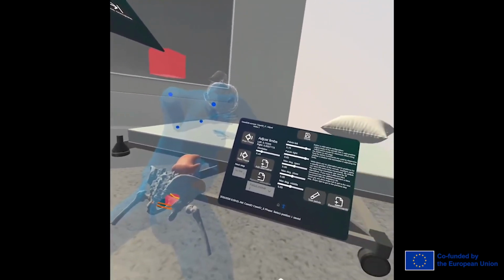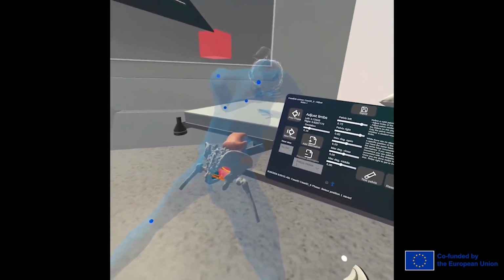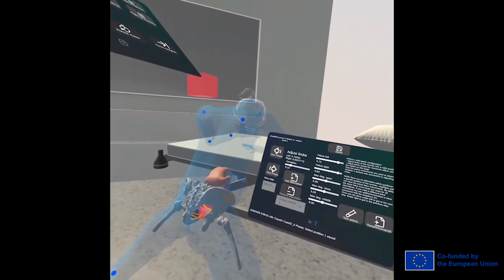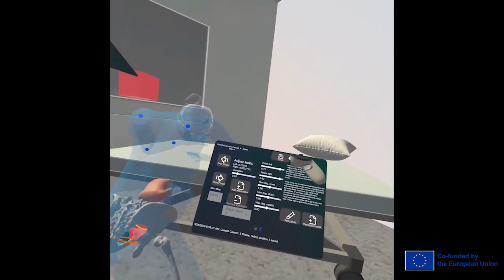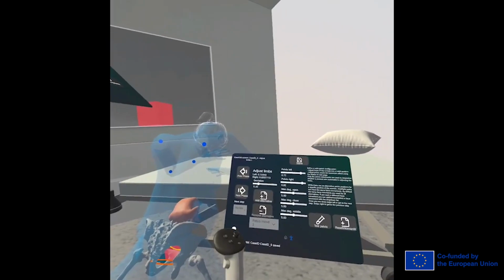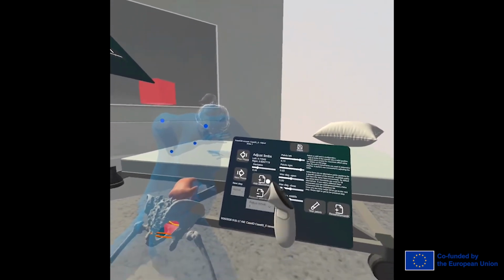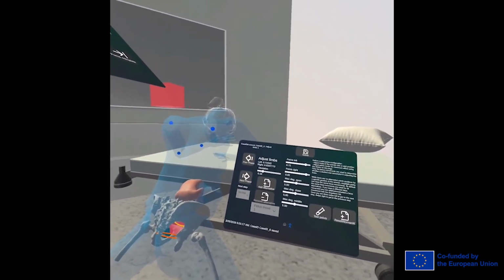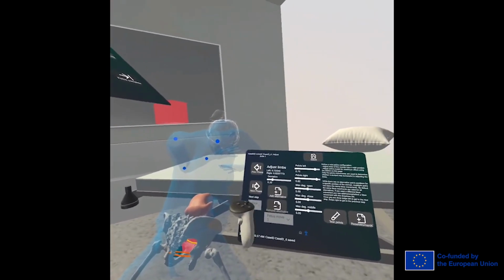In here, you can also adjust to which extent it's possible for the students to deviate from your desired position, and to which extent the app will accept it as a correct position. Alright, I'll just hit save so that we do not lose our data so far, and I'll proceed to the next phase. Additionally, you can add an alternative. So you can add multiple paths in which the students can arrive to the final correct position.